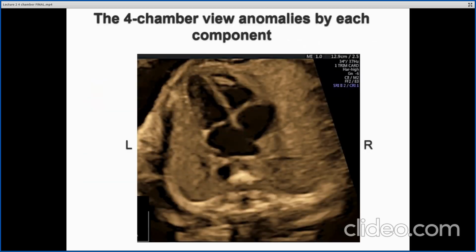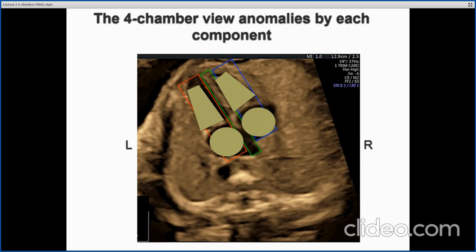From the perspective of abnormalities, the four-chamber view can actually be evaluated in different segments. First, we start our examination with the left heart and anomalies for that. Then we look for right heart abnormalities. Then we look for abnormalities of the septa and the crux of the heart. Then we can look for intracavitary lesions or changes inside the cavity of the heart. Look for abnormalities in the area around the heart, and finally look for variations in the area behind the heart.